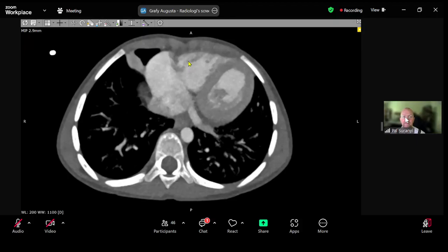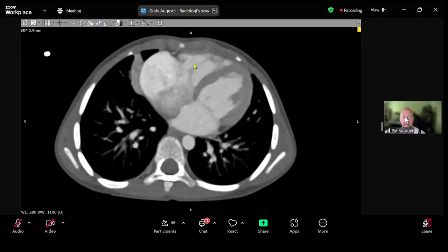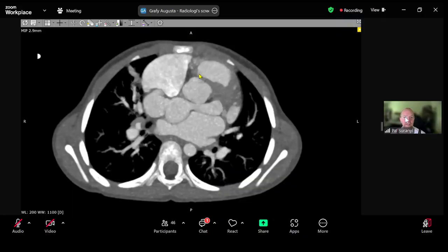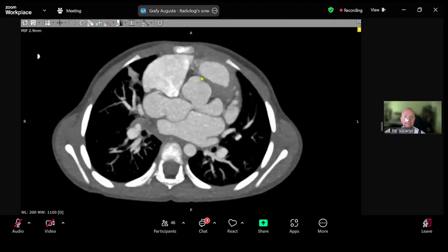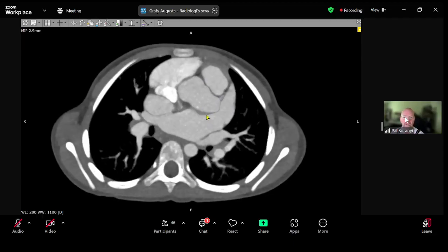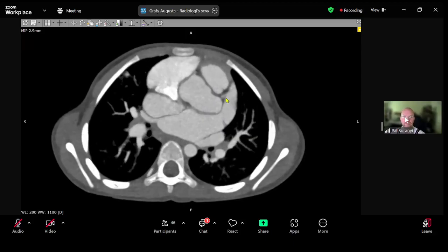So that in and of itself is not that surprising, but we would scroll to the proximal RCA and see if there is anything sneaking right there between the aorta and the right atrial appendage, and I don't see a vessel there. So I think it's still very likely that we're dealing with an aneurysmal SA nodal artery, but I'm not sure. We cannot be sure. You are correct in that it most commonly arises from the right coronary artery and goes on the other side.